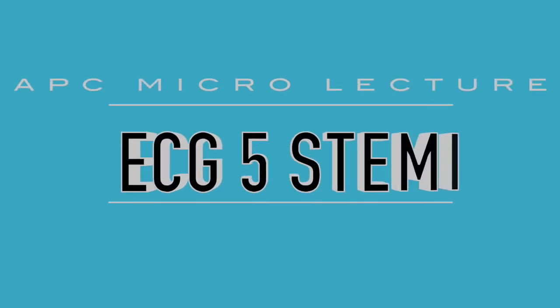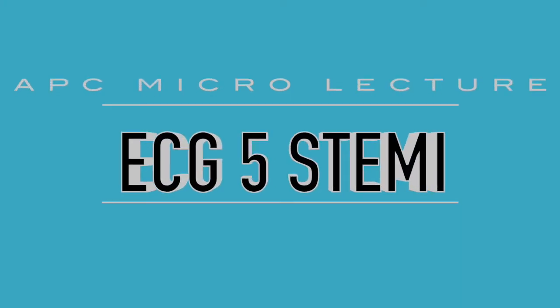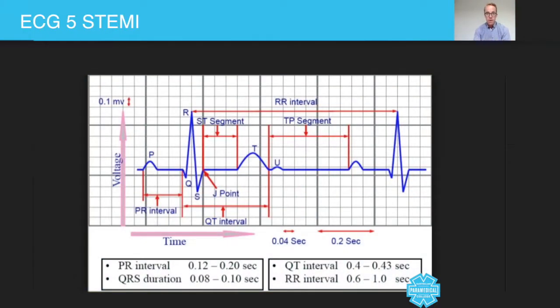Hey guys, in today's micro lecture, we're going to talk about the J point. Now, in previous ECG lectures, we've already talked about the voltage, time, PR interval, the P wave, the QRS. And now we need to move this conversation on a little bit more to try and help you guys to be able to recognize an ST segment. That's this part here. Elevation, that's when the J point elevates more than two small squares.